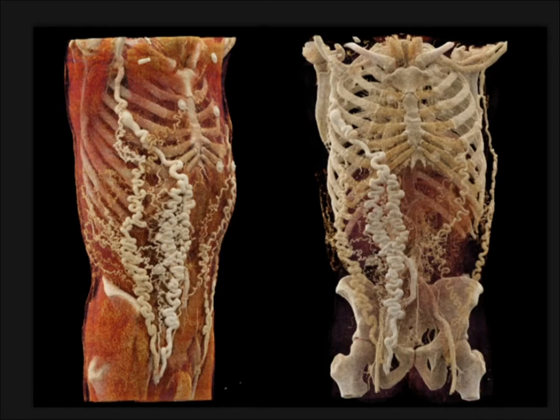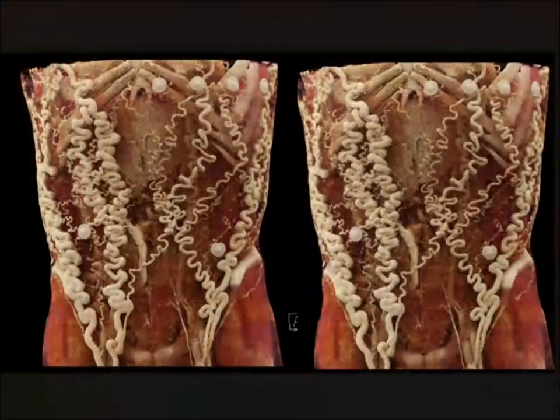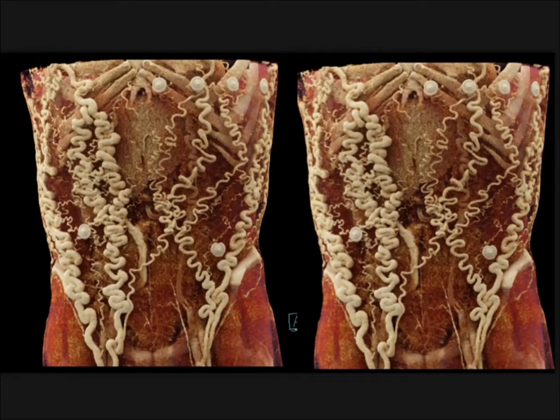So you can see what we're able to do. We're really able to guide ourselves into looking interactively at the volume, choosing the right planes and parameters, creating the best images that allow us to show the clinician the pathology that's present. This all becomes something that's a critical part of what we do and how we do it. Again, just cranking out images is not going to be enough.